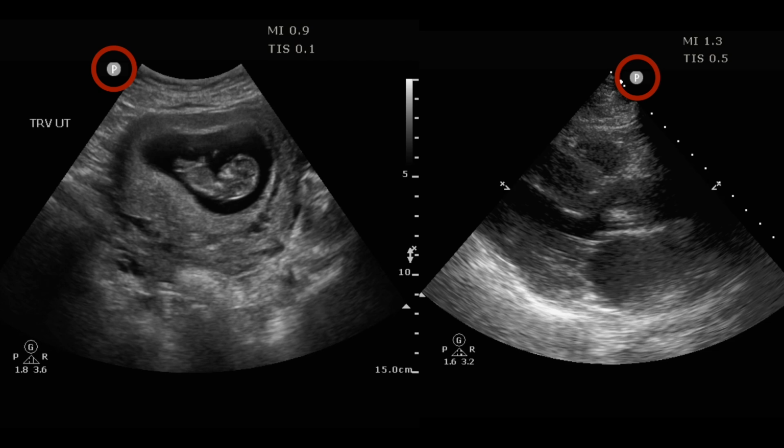On the left, you see a nice, smiley, happy picture of a baby, and this is in radiology convention. If you see the circle up there in the top left, the probe indicator is on the left-hand side of the screen. Whereas on the right-hand side of our window, you'll see an echo, a heart, and you'll see that same probe indicator, but it's on the opposite side, on the right-hand side of the ultrasound sector. This is because radiology and cardiology have two different orientation conventions when they do their ultrasound: radiology to the left, cardiology to the right on the screen.